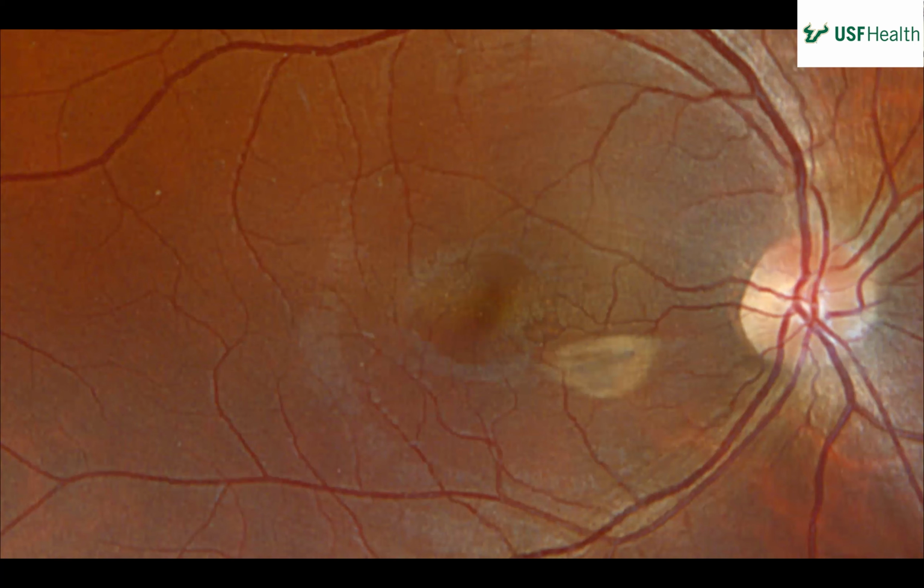So what'd you do for this one? I would say third disc area, yellow, fuzzy borders. It's superficial because it looks like a napkin over the vessels. Best as I can tell, it's flat because it's all in focus. And it's associated with the juxtafoveal area. It's not of fuzzy vessels. Borders, I disagree.